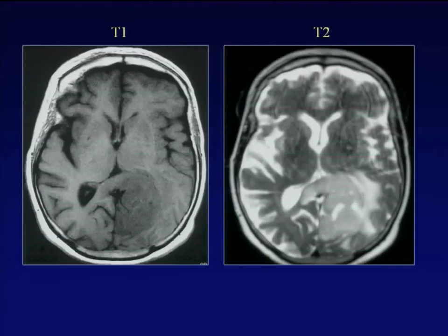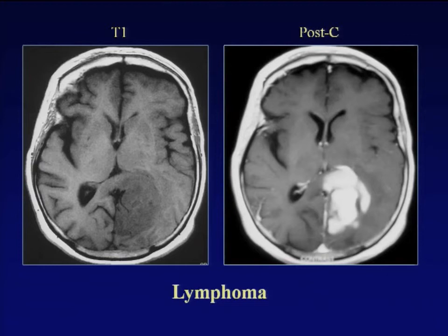This is a case of a lymphoma. You see on T1, the deep subependymal location. On T2, it's quite low on T2. And post-contrast, you see the abnormal enhancement.